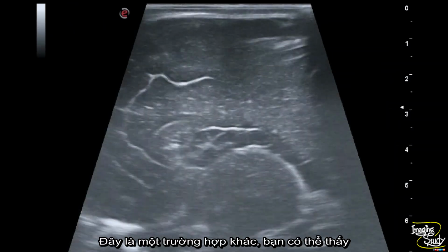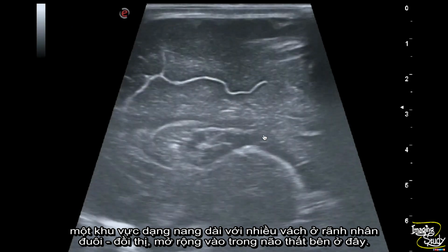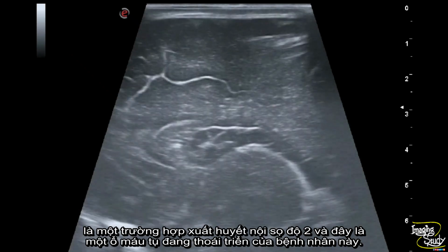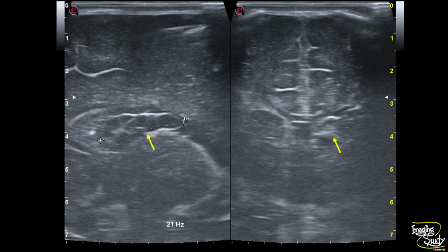Here's another case. You can see a multiseptate elongated cystic area at the caudothalamic groove extending to the lateral ventricle here. This is the picture of the patient I have shown you as a grade 2 intracranial hemorrhage, and this is nothing but the resolving hematoma of the patient.